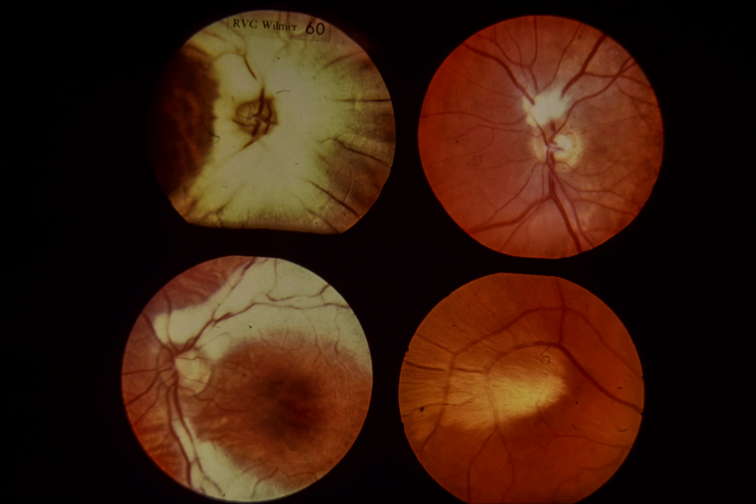Lower left, occasionally, retinal nerve fiber myelination begins at the disc and extends peripherally in one direction only. This patient has extensive myelination of the superior and inferior temporal arcuate bundles. Lower right, although myelination is most common adjacent to the optic disc, patches of peripheral myelination may be seen. We now leave congenital anomalies of the optic disc and begin our discussion of optic atrophy.